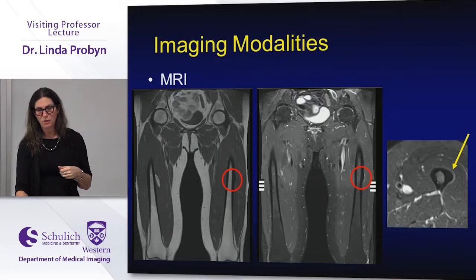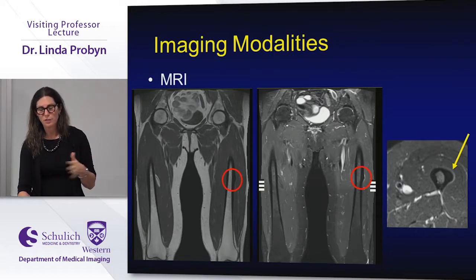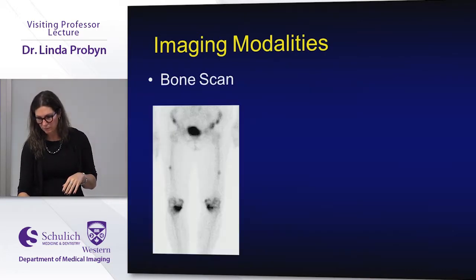So that's what they look like on MRI. And again, it's really just to be aware of it. We don't typically do MRIs just for this. One of my colleagues has done a whole cost analysis on it. It certainly is not the right imaging to start with.